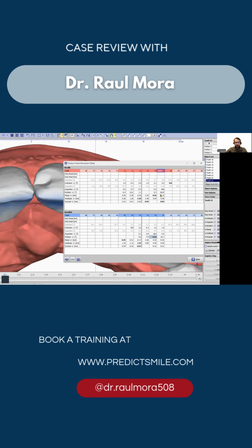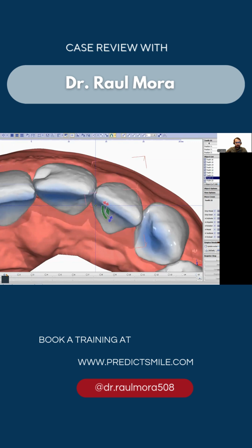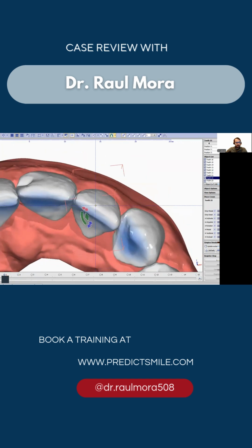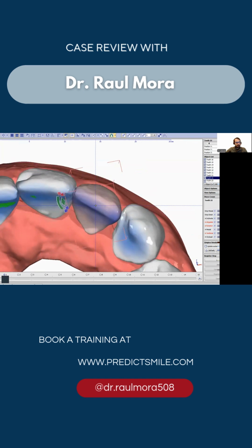It has 5 degrees of rotation and some slight pro inclination, so nothing severe. So let's go again to step 1. If I need the movement from the beginning, I do it on step 1. If I need it later, I do it in the final steps. It's only 5 degrees, so let's do around 4.